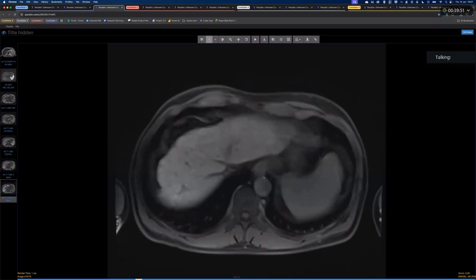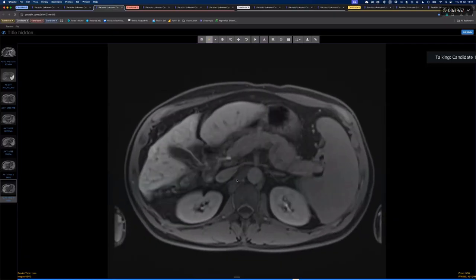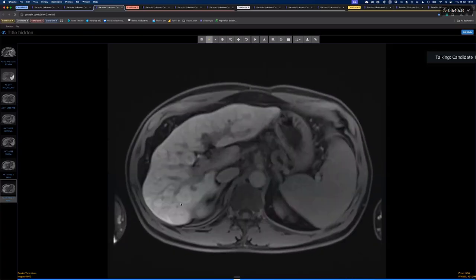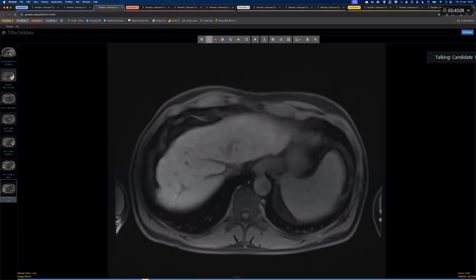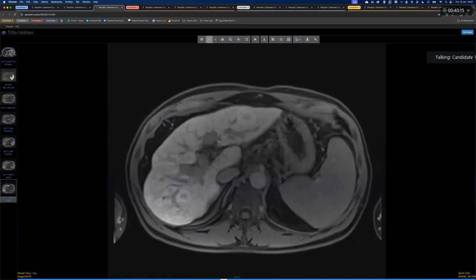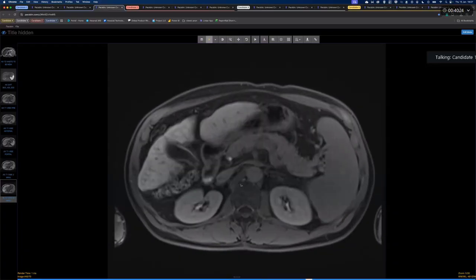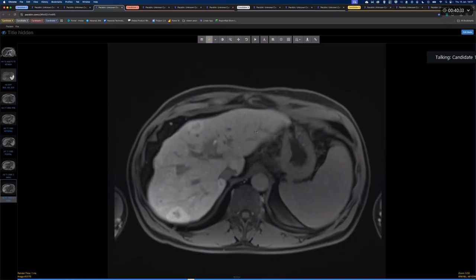Okay. So I can see that there are multiple irregular liver lesions involving segment 7 and segment 4A of the liver, subcapsular with peripheral enhancement and central areas of non-enhancement. Another lesion seen on segment 2. These lesions, they are numerous, distributed on both lobes.